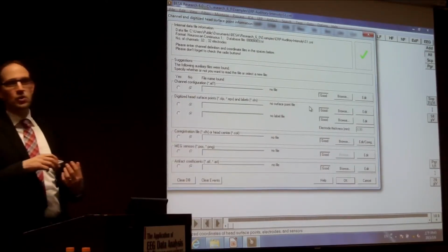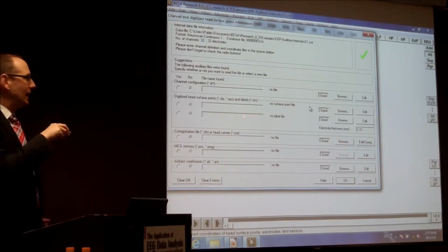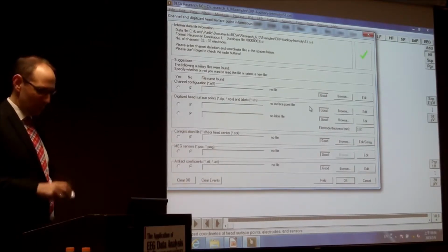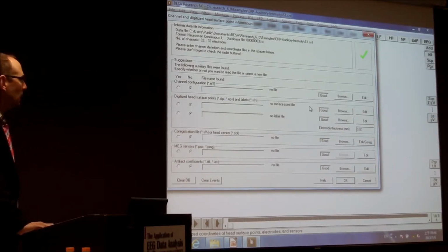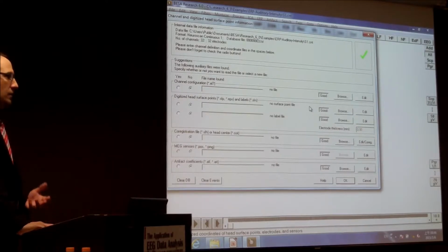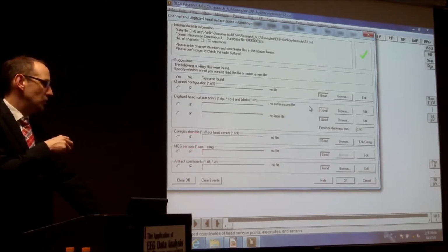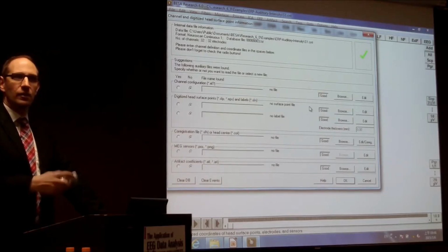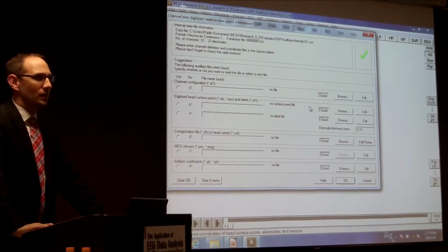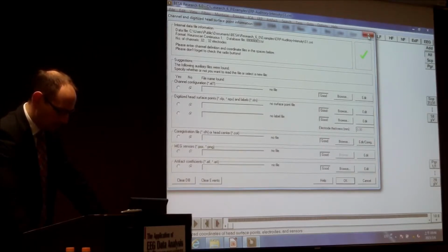So that's a very important feature about BESA. In this case, everything is good because we don't need it, because it's not available at the moment. But if there's something available and it's not okay, then it will be mentioned bad here, and you will see not a tick mark, you will see a red cross, that something is not good. So this is very important sometimes, that you have to load associated data. If it comes to the MEG, for example, you want to see the positions of the MEG sensors. Some of the data files do not have the information of the MEG sensors stored within, so you have to associate them. And unfortunately, they do not always have the same name, so it's not always done automatically. Okay, I will come back to that later.